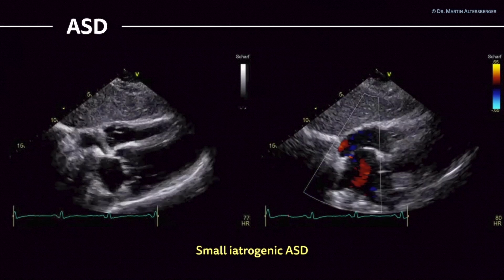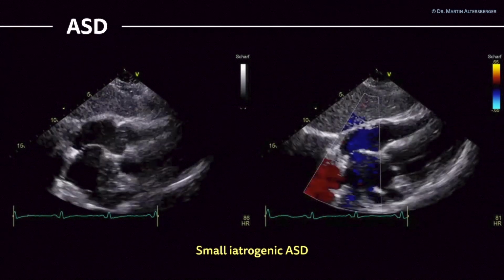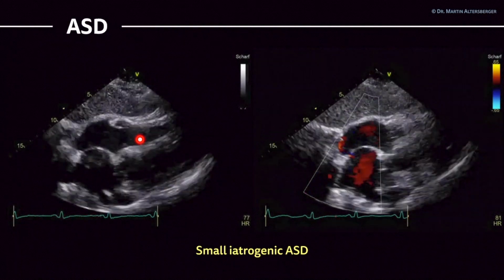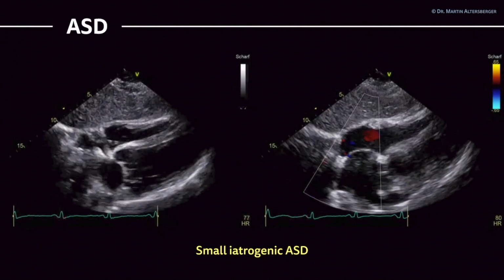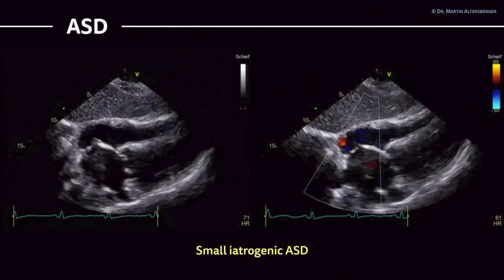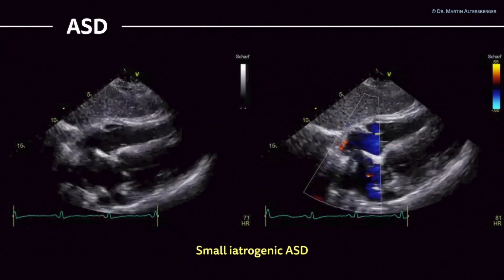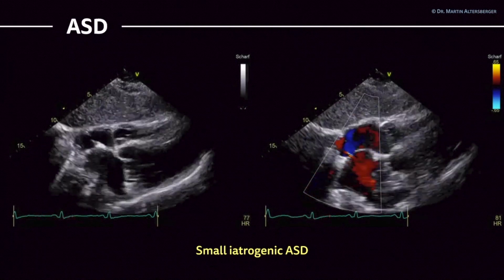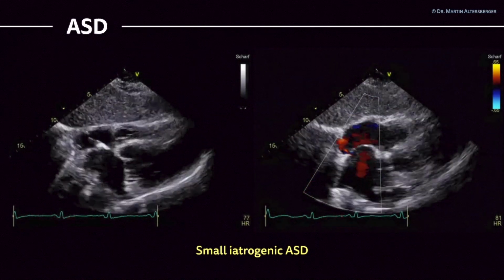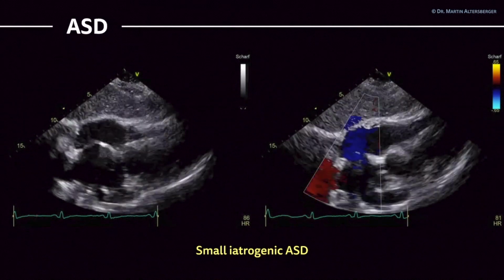Here you have another rather interesting case. This is a patient with coronary artery disease. How can you assume that this is coronary artery disease? Well, here you see the basal parts of the interventricular septum. They're definitely thin and hyperechogenic, and of course, in the overall echo, you saw wall motion abnormalities, scars, and also this patient had a history of coronary artery disease and also had a STEMI just a few weeks before.